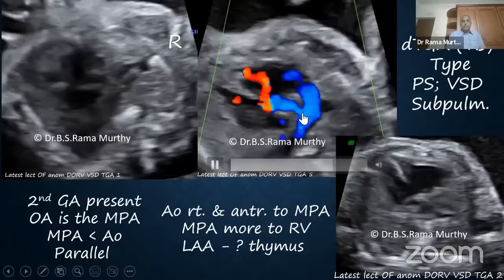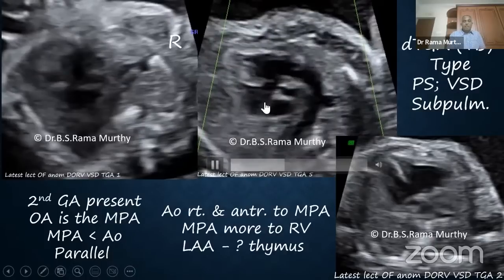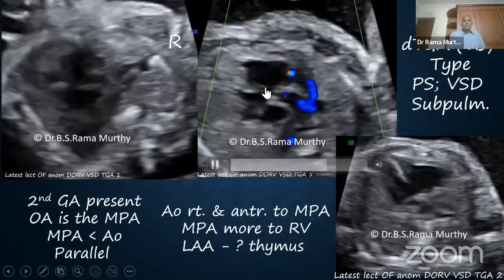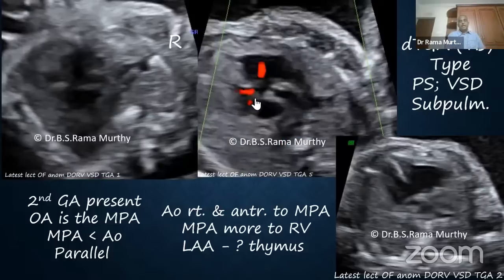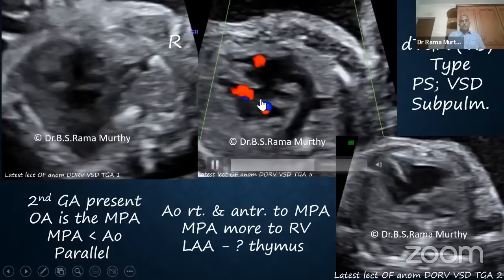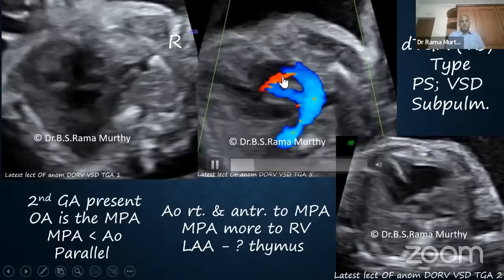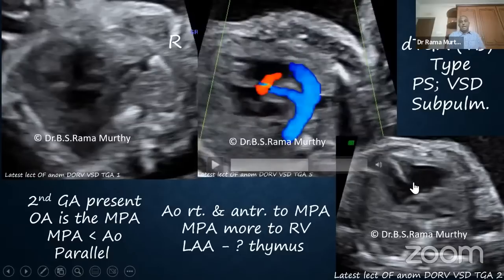parallelism over here, and also the fact that the VSD in DORV is a one-way VSD. So one-way VSD, blood flows from the left ventricle into the right ventricle. So you see only a red coding across the VSD. So that is a classical Taussig-Bing anomaly.